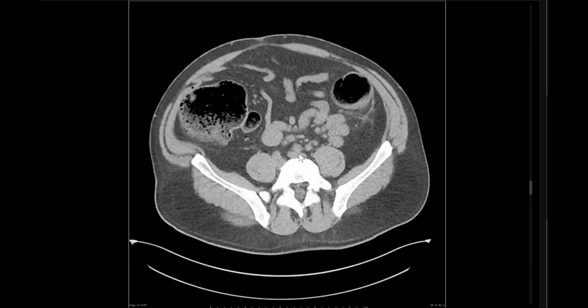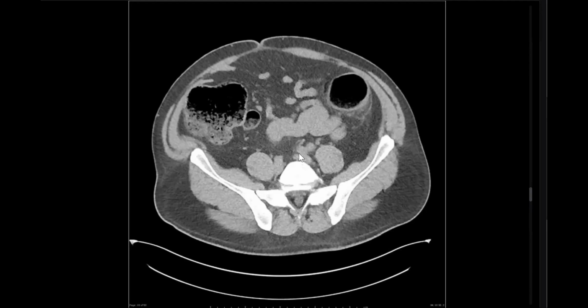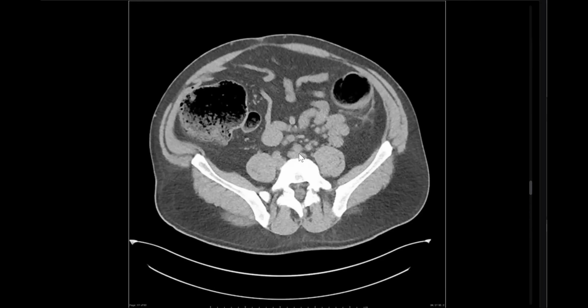I would like to check also in lung window if there is any associated complicated perforation. And since you put a possibility of colorectal carcinoma, the lung window will be beneficial in assessing if there is any lung metastasis. Good. In the basal lung cuts, I couldn't see any lung metastasis and no pleural effusion. And bone window. Since you mentioned the possibility of a colon cancer, complete the case, searching for any metastasis.